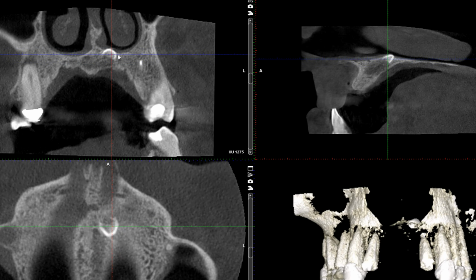It was really hard to interpret, and if you didn't pay close attention, I'm sure that most of you would have missed it. But now with the help of cone beam CT, we know exactly where it is located, and the fact that it actually is inverted, right? That's really cool. It's cool that we can see it so clearly now.